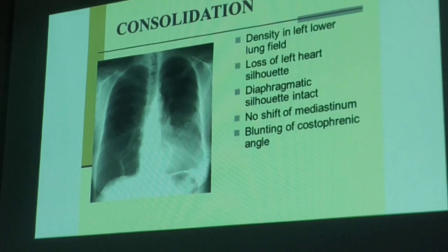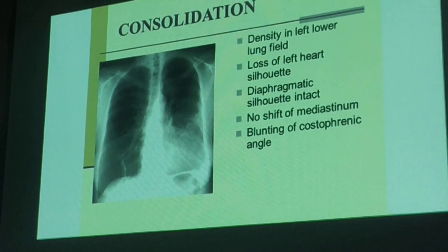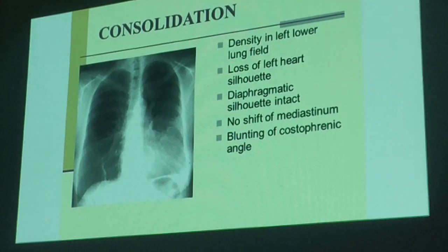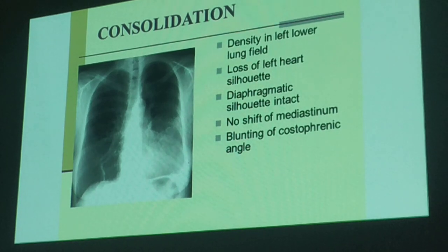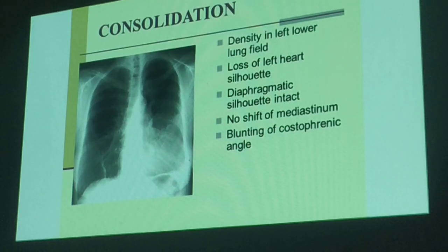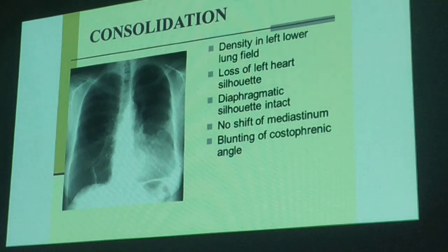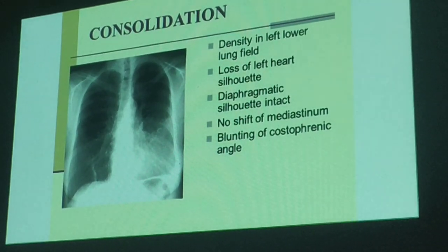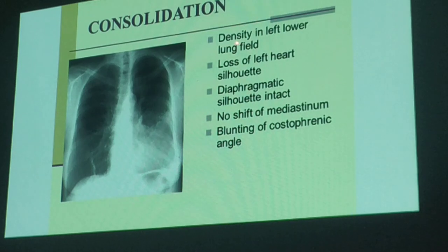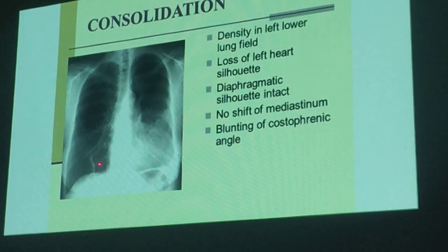But we radiologists make it simpler for others to understand. We would describe this haziness at the left lower lung. It looks hazy, right? Or other radiologists would say hazy infiltrates. Okay? So, you try to study the density of the left lower lung. So this is more dense as you compare it with the right lower lung.